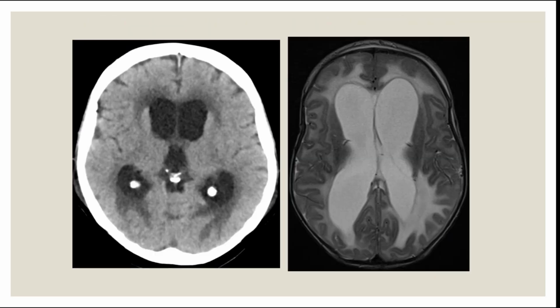Last one, the last image. Again, these are two different modalities, two different techniques. Exactly, CT, and this is MRI T2. Now, what's the main issue? What's happening in these two images?